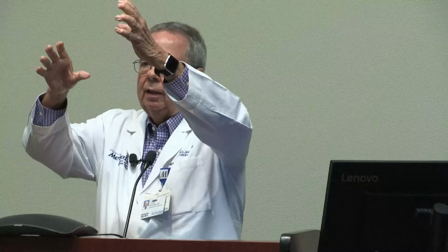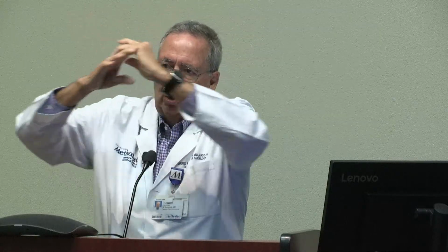Dr. Q, I have a question. What's the utility of global circumferential strain or radial, and can we incorporate it with longitudinal strain? So the heart, as you know, has fibers oriented like this, crossing over like this. So when you squeeze, you get a much better circumferential vector than longitudinal.